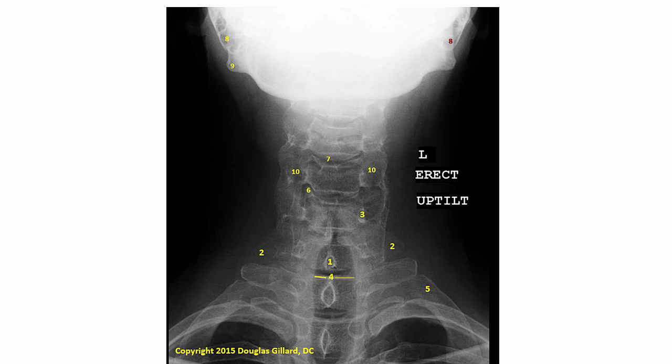Okay, X-ray. It's not an X-ray, right? It's a radiograph. Radiograph, we can see, what's this structure? Mastoid process, you can see the air cells in it. What's this bump? Well, that's the angle of the mandible right there. Put your finger back there and you can feel how it has a little divot and it makes it stick way out. So missing C1 and C2 here, but you can see these are all the articular pillars going down.